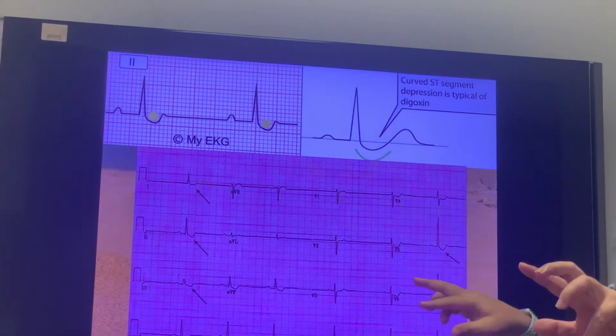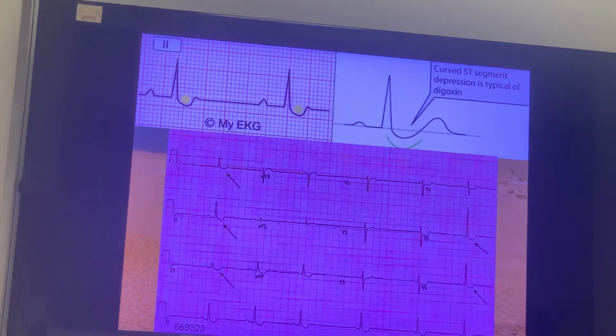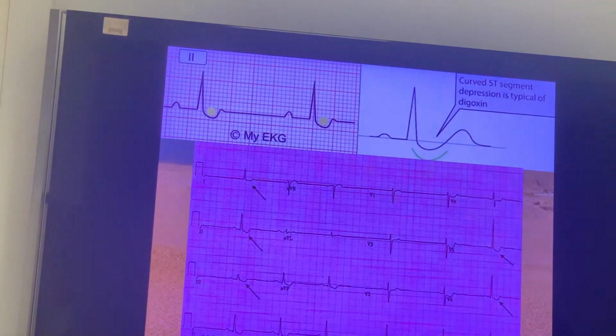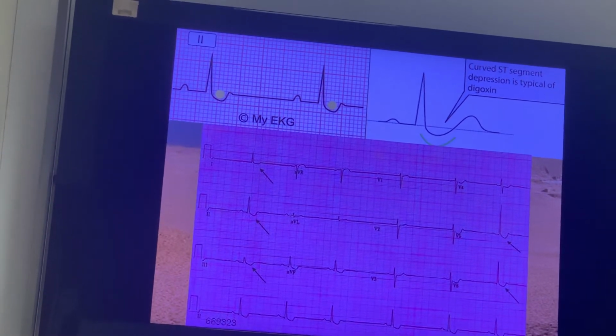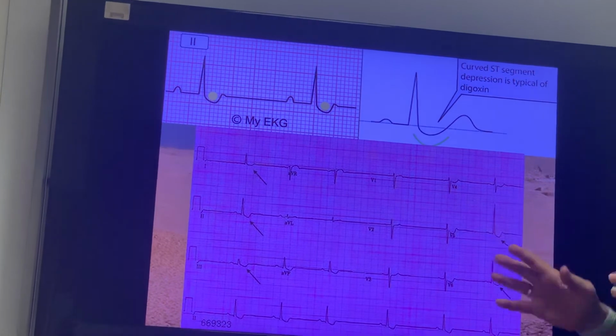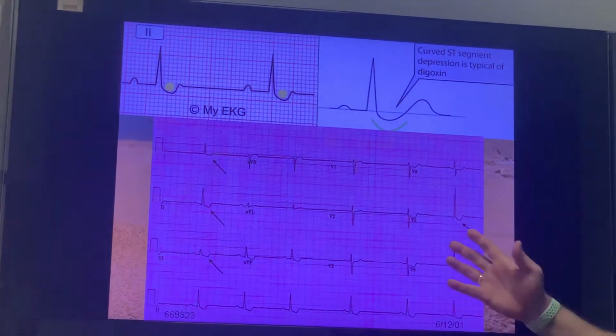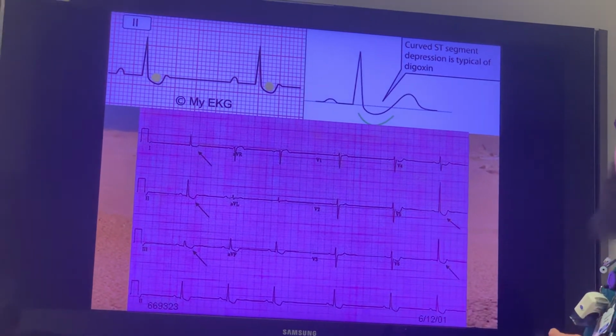What's it? Talkspace. The system, you know. You get the GP notes, and they found digitalis as one of the medications. It is not a sign of digitalis toxicity. Oh, is it? No, it is digitalis effect. If he is on digitalis, he will have it. It doesn't give me any information about it having toxicity or not. It is only that anyone on digitalis could develop these changes.